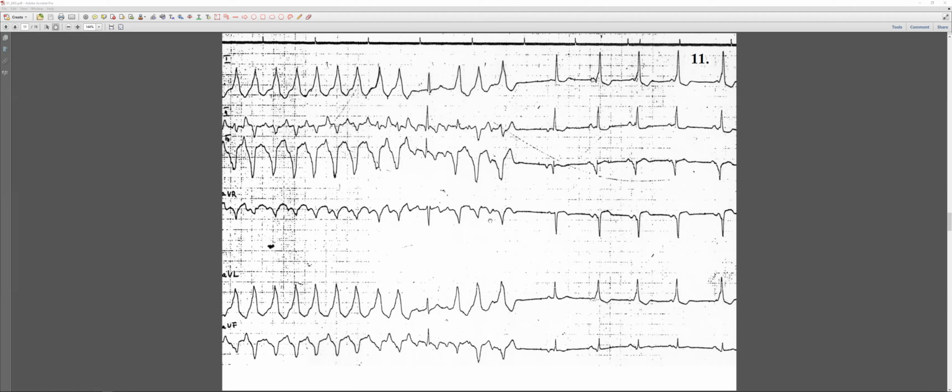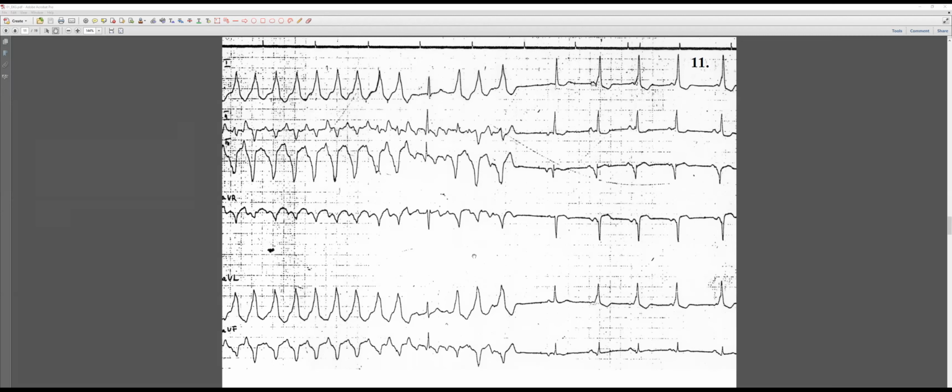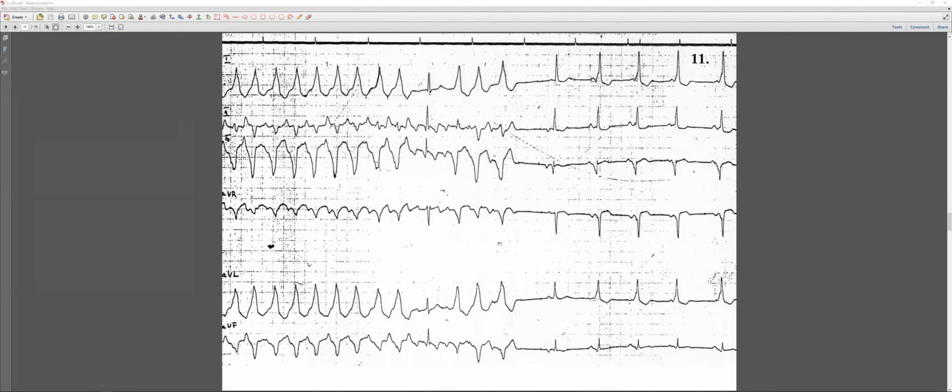In the middle, what did they do with the patient? Basically, they changed something in the AV conduction. How can you change the AV conduction? Maybe a vagal or Valsalva maneuver, or vagal stimulation. Yes, carotid massage, and this is hard. The tachycardia is stopped.